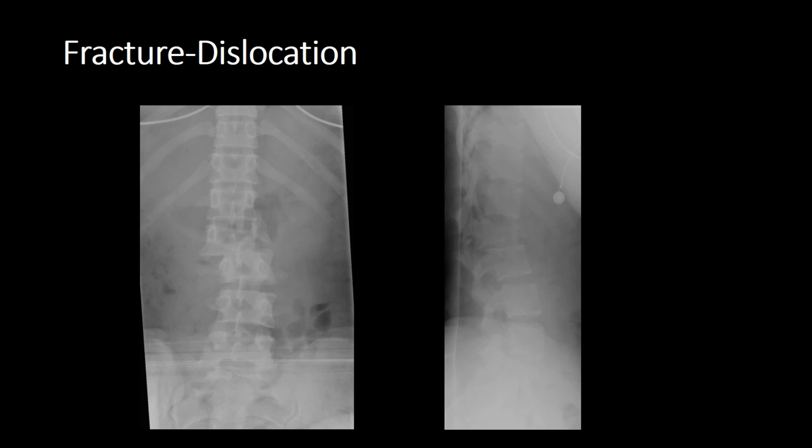So conversely, on our lateral view, we can actually see the complete vertebral bodies, the squaring of the vertebral bodies of the distal portion. So at this point, L3, 4 and 5 are oriented in the pure lateral position. Whereas if you come up the posterior column, we can see the posterior cortex of the vertebra, indicating there's a degree of rotation. So it makes it quite difficult to assess the posterior vertebral line. But certainly the posterior vertebral line along here is normal. If you look carefully, you can actually see a fracture fragment within the vertebral foramen.